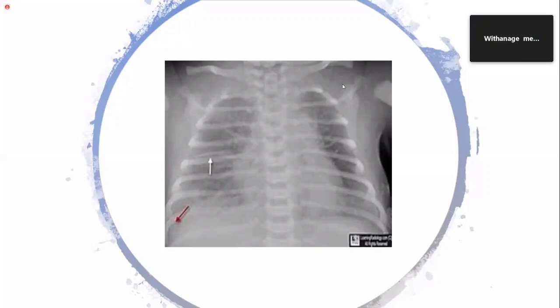Transient tachypnea of newborn, sir. Good. Transient tachypnea of newborn. Why do you say transient? What is the reason? What is transient tachypnea of newborn? What is it, first of all? What happens in it?